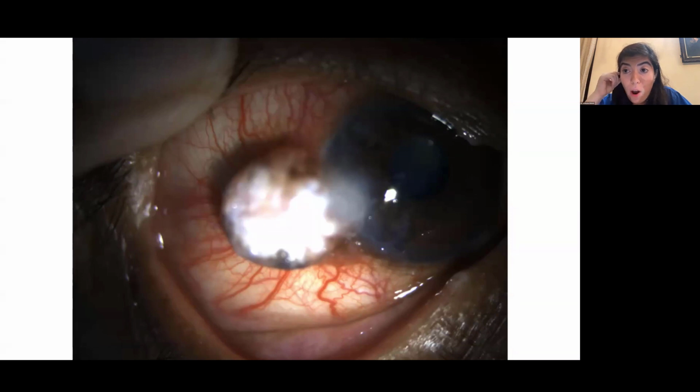Another question that was brought up prior to the lecture was, how do you assess CIN, OSSN, epithelial disease versus squamous cell carcinoma that's invasive? So here's an example for you of a patient of mine with invasive squamous cell carcinoma.